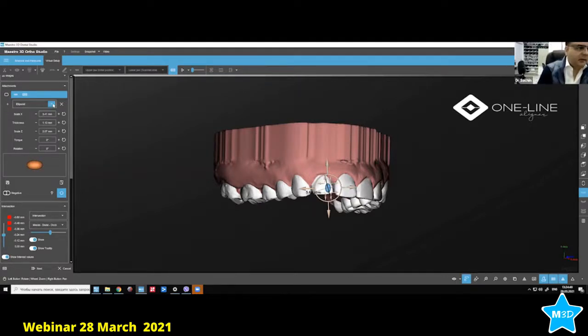But the one which I like the most will be, as I said, the optimized root control. And I'll just go back to the shape which was before. So when you move it like this, you're giving the direction on the mesial side to go inside. Sometimes some people use it like this. Not my favorite position, but this is a good place to go.